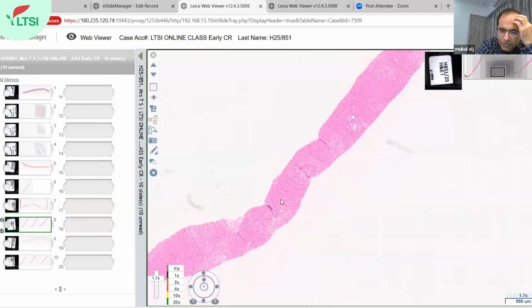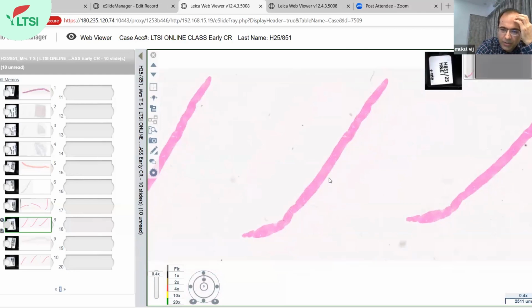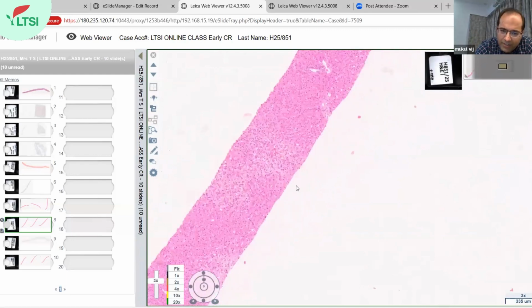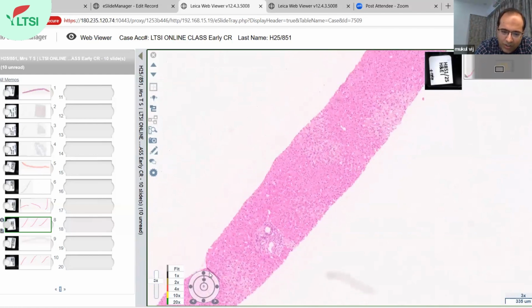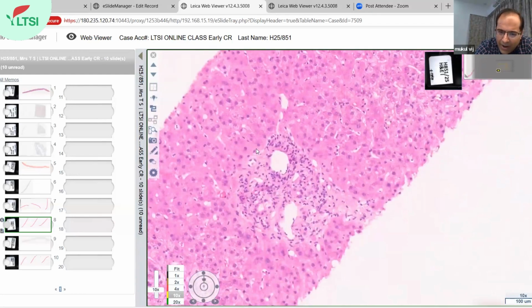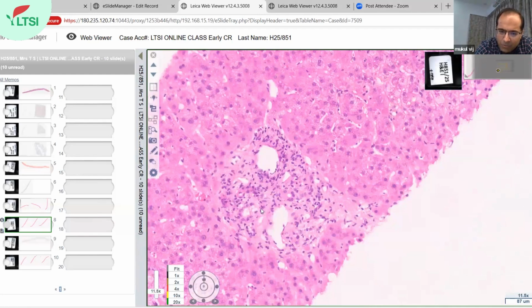Okay, so this biopsy is done after so much therapy given. This is the core. There's a nice core. You can see it's probably a 2 centimeter core of liver biopsy, and we go in the high power. Definitely inflammation is less. Not much blue areas. There's a portal tract here. There is some mild inflammation, maybe some endothelitis. This is a portal vein. It's a little expanded, this portal tract. This is an arteriole, a little distorted arteriole.